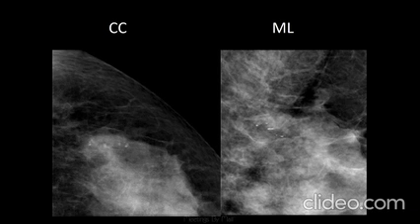If you suspect that they are milk of calcium and they are not layering, then I like to do what we call a delayed view. So put the patient in the straight lateral view, either the full breast straight lateral view or a magnification view, and make that poor patient stay like that for a minute or two. And the calcifications will layer very many times, and sometimes you'll even see that when you take them to stereo or tomobiopsy. If you biopsy in that position and you leave them for a minute before you do the biopsy, you can sometimes even cancel it.